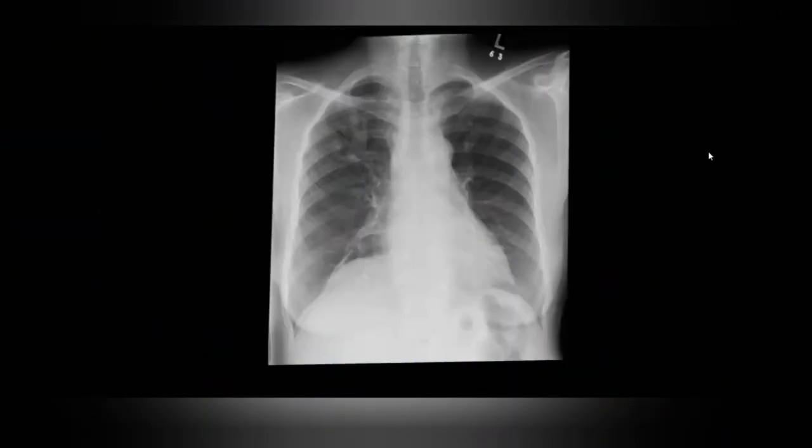So we're presented with this X-ray. I'm provided with a chest X-ray frontal projection of a mature skeleton, in which I can appreciate that there appear to be tubular opacities noted in the right upper zone, giving a finger-in-glove pattern.